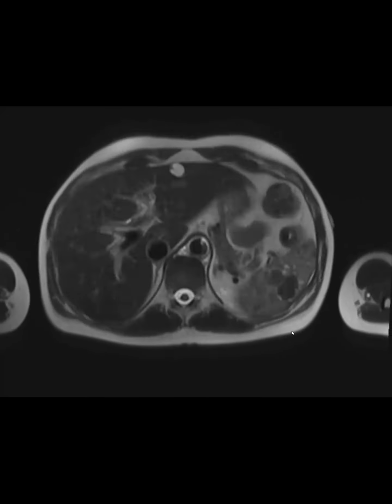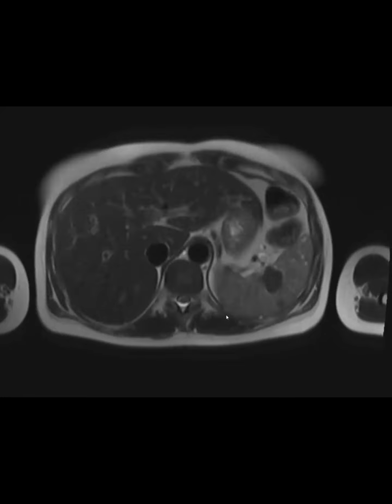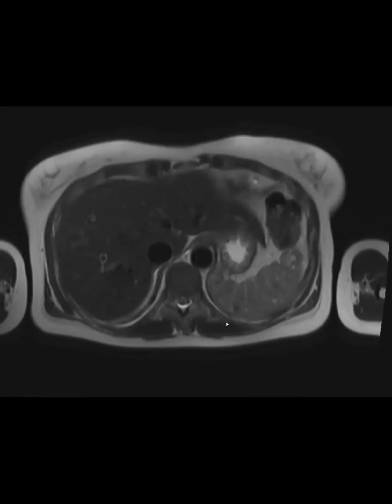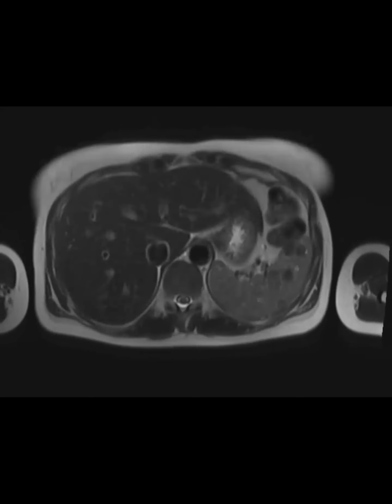Did you find anything else about their imaging? Not really. I think they're a little bright on the fat sat T2s, but on the HASTE, it says T1 and T2 dark. I pulled up a few papers. There's an AJR, an old paper, and they basically have a CT case, but yeah, I think you're right, T1 and T2 hypointense. Okay, that is my thing about littoral cell angioma.